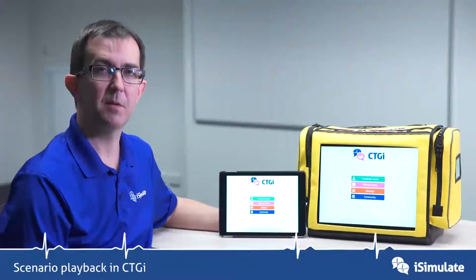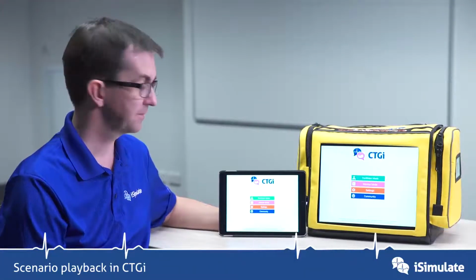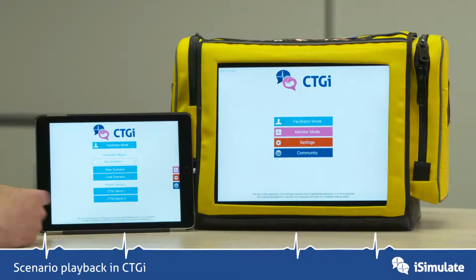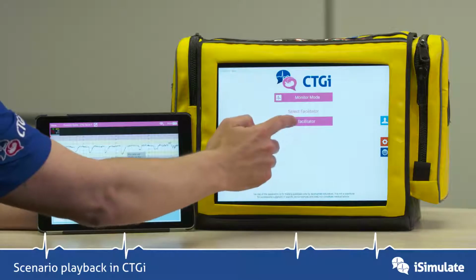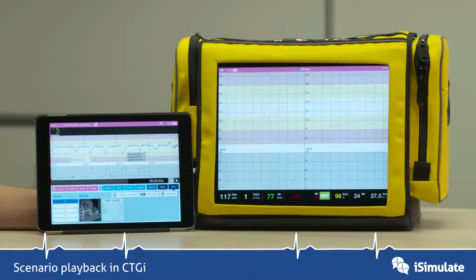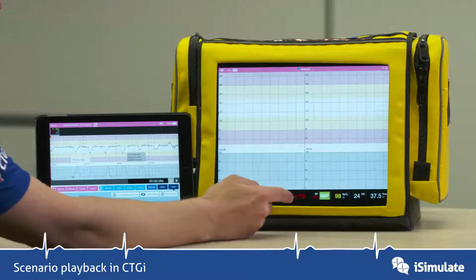So let's look how we can play back scenarios and how we can adjust the look and feel of this in CTGi. We go into facilitator mode and we pick CTGi Demo 1. Now I'm on the student screen, I'm going to pick monitor mode and pick my facilitator. So let's press play. And I'm going to tap on the NIBP button here to give us the blood pressure as well.